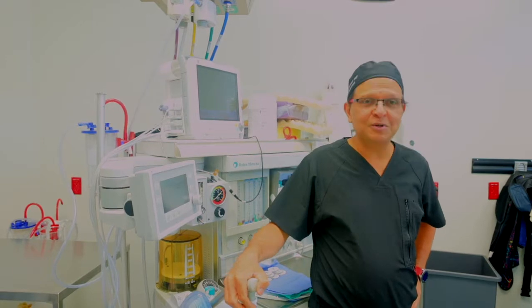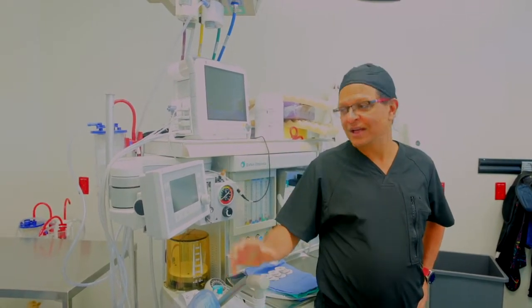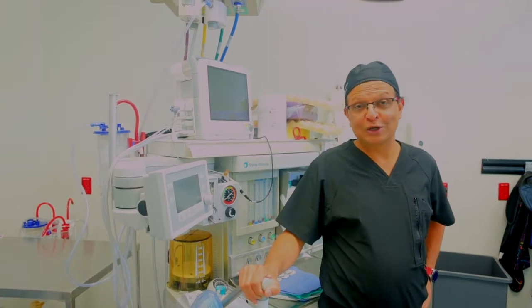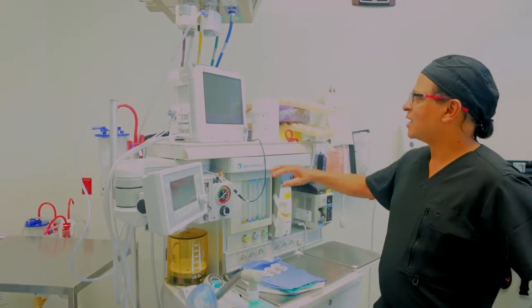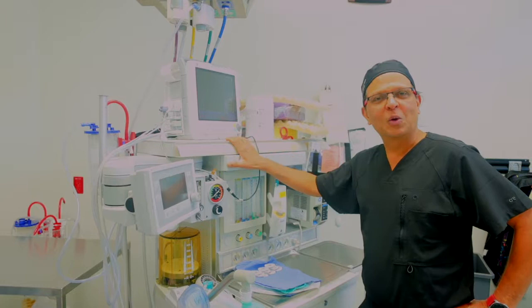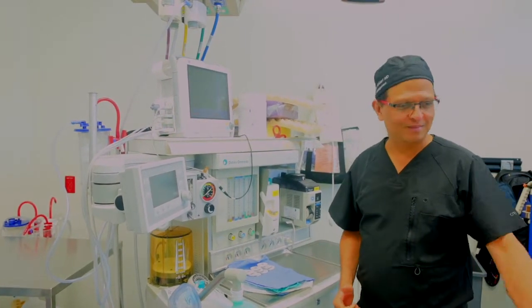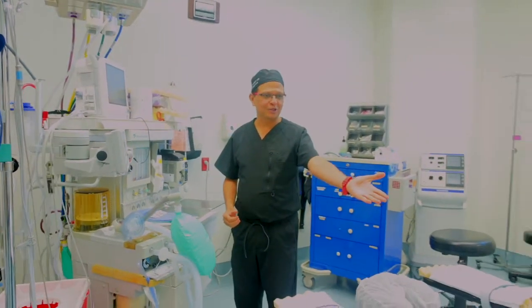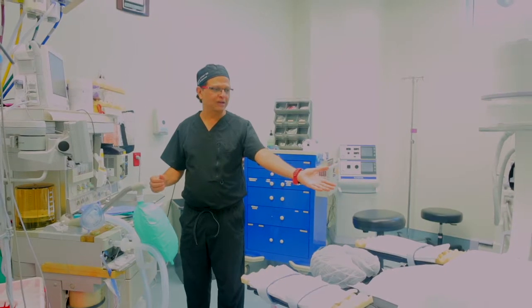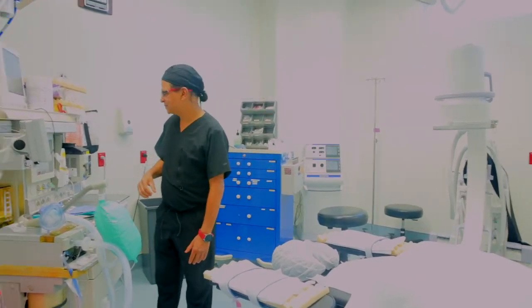When it is not hooked up to the patient, when it is accidentally disconnected, it will give that alarm to alert the anesthesia provider, stating that the patient needs to be taken care of. When all the alarms are going off when you walk in, the patient is not even on the table. Like you see now, there is no patient on the table. It is an empty room. We are doing it in an empty room just to show all the setup that we have.